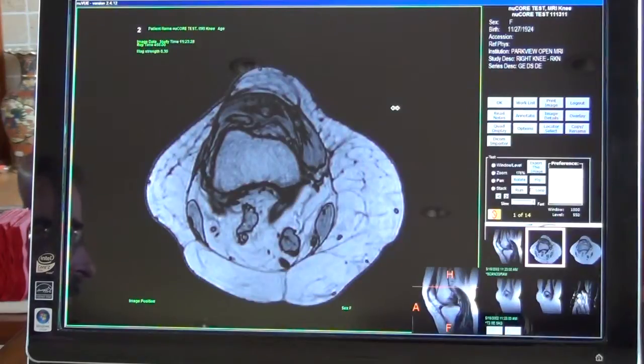As we move back to a full view of the desktop area, again, notice that there are no icons anywhere on the screen. In fact, there are no drop-down menus for you to select from. This keeps the viewing area clean, uncluttered, but designed with text buttons that are easy to read and easy for you to find the related function to enhance your digital reading.